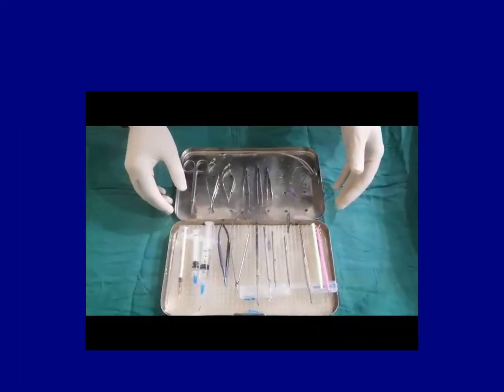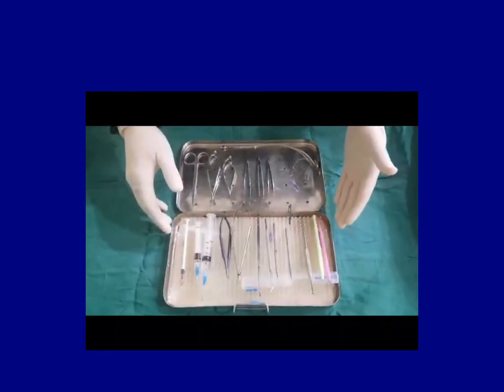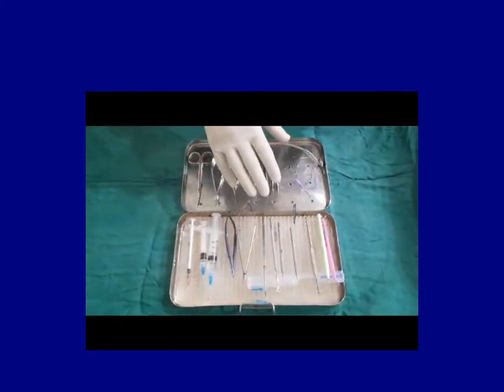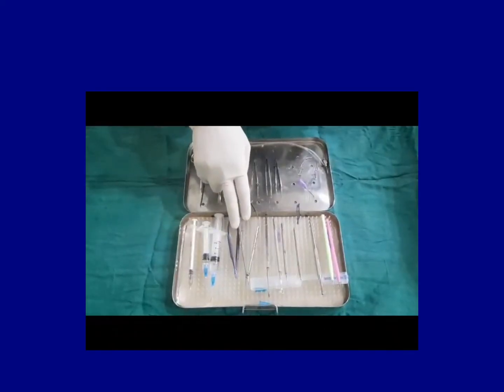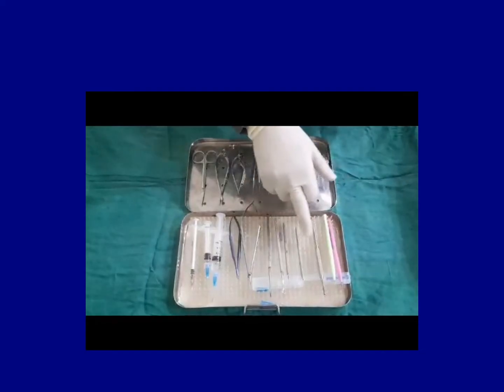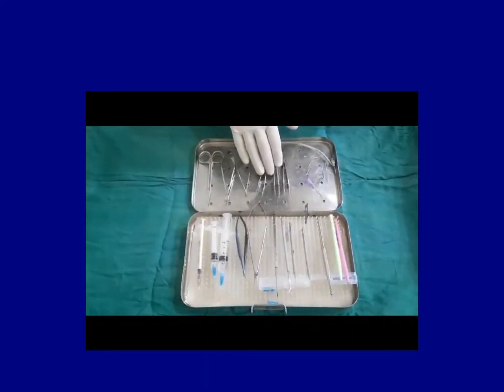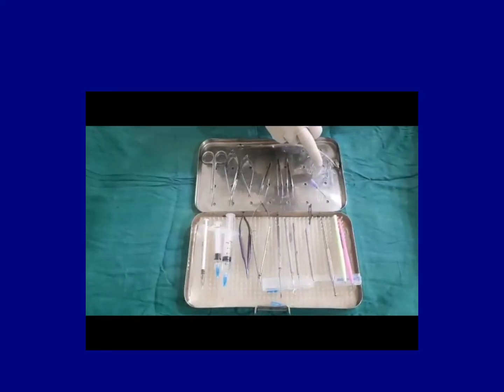Welcome to myeyecademy.com. We are going to discuss the cataract set, the set that is normally used in cataract surgery. For your ease, I've divided the instruments into 6 different groups. These are the syringes, number 1. Number 2 are the needle holders. Number 3 are the cylindrical instruments that I'm going to describe in a minute. Number 4 are the scissors. Number 5 are the forceps, these 3 forceps. And number 6 are these miscellaneous instruments. So I'm going to do them one by one.